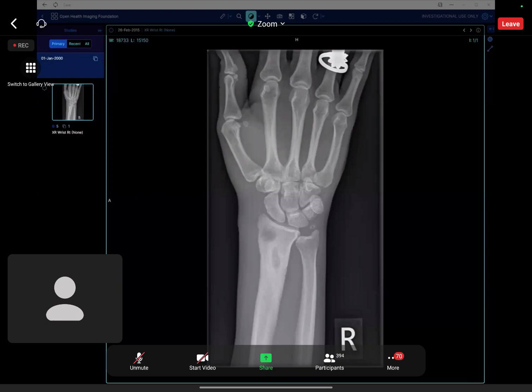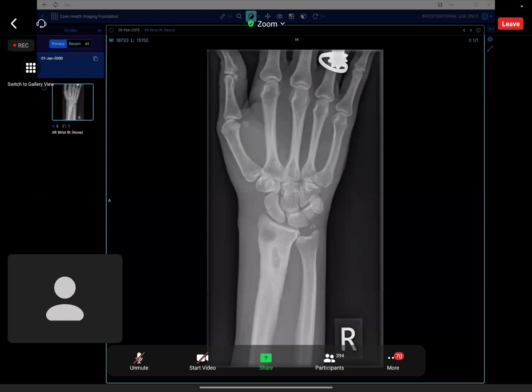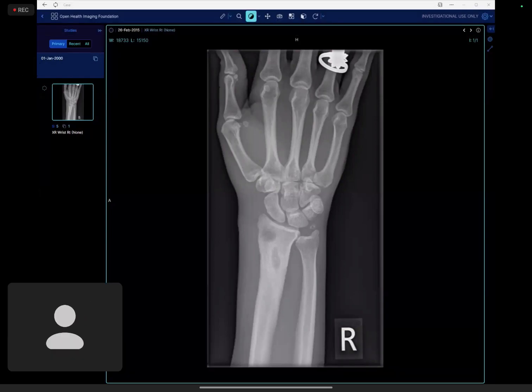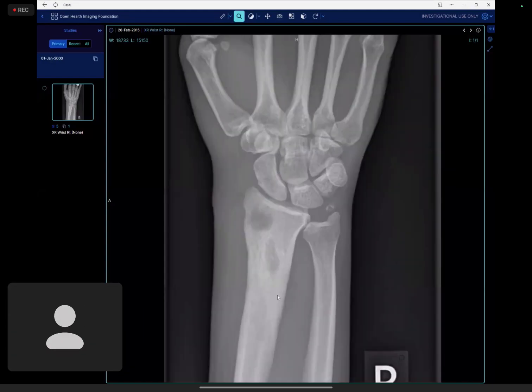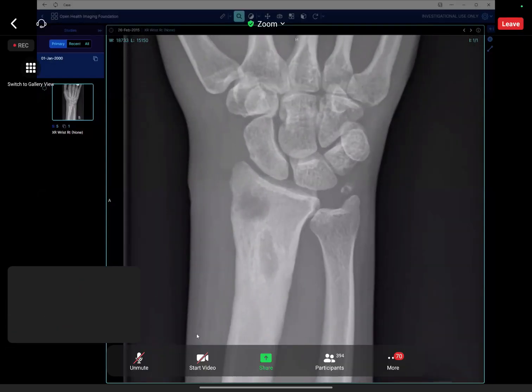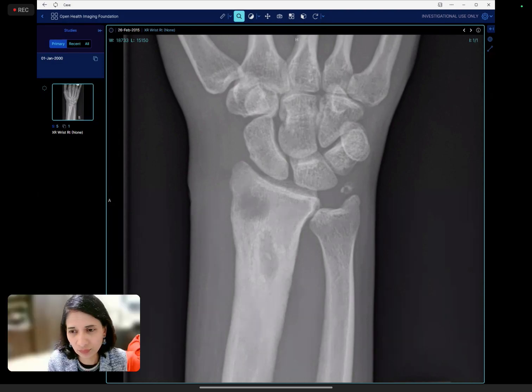Maybe it's a Brodie's abscess, because there is sclerosis in one of the lesions and it's in the metaphyseal region. So I would think of a Brodie's abscess or a subacute stage of osteomyelitis. Because it's a middle-aged patient, if there is a history of IV drug abuse, that could be one of the causes in this case.